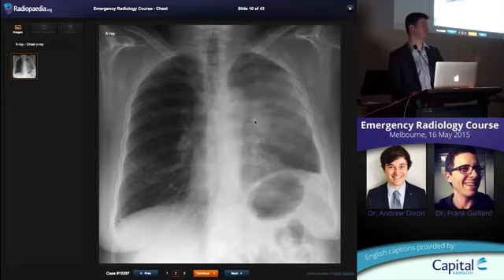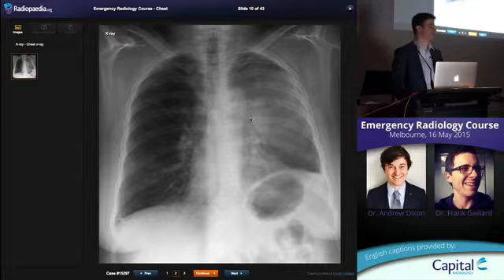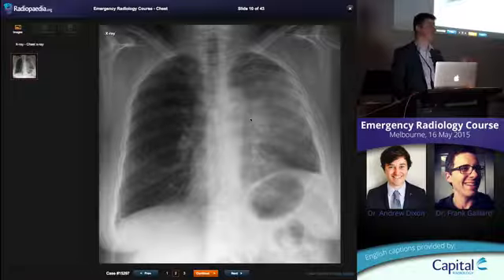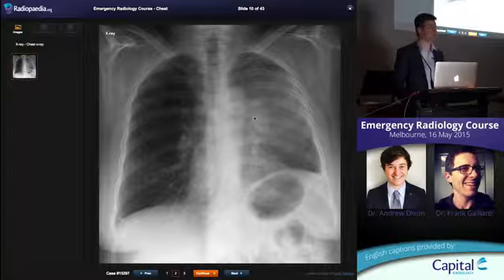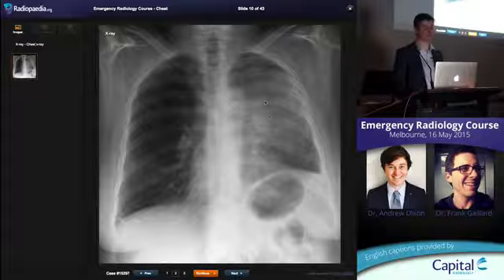If you have a patient presenting out of the blue with a left upper lobe collapse, you've always got to do a CT to look for a cancer. If the patient's intubated in ICU, the most likely cause is going to be a mucus plug getting into the airway, blocking it off. But in just out of the blue, presenting with shortness of breath, a cancer is going to be the thing to look for. Asthmatic patients can sometimes present with a mucus plug as well in younger patients, but an older patient presenting with left upper lobe collapse, this is going to be your tumour, lung cancer here.